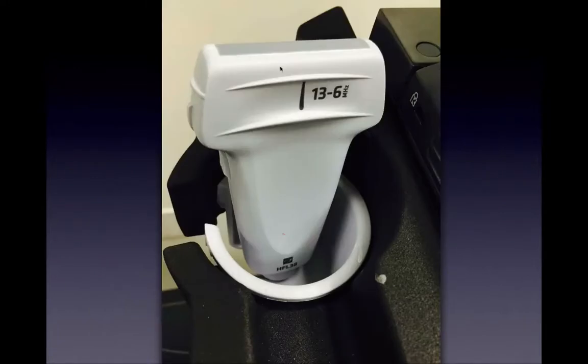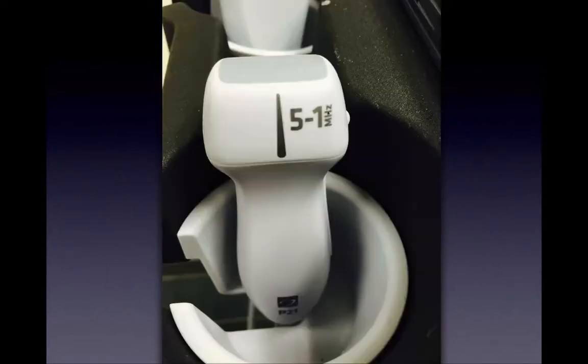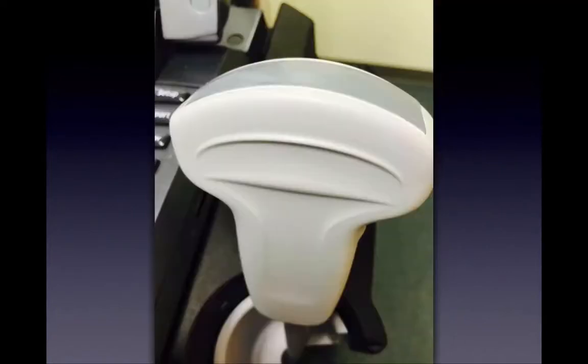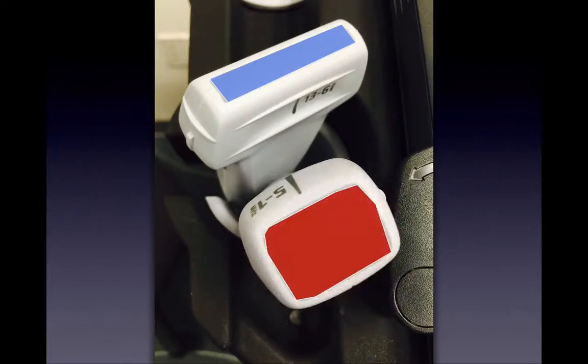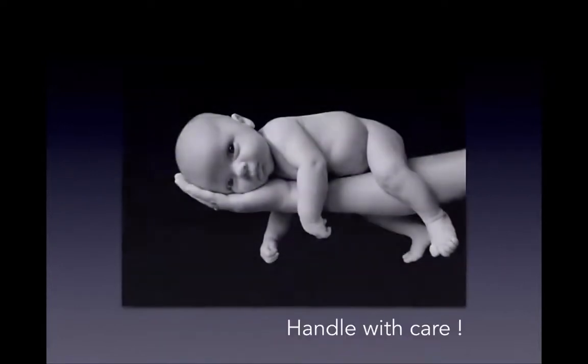This is a high frequency linear, kind of flat looking. You see that it's 6 to 13 megahertz. This is called a phased array, and this is the abdominal probe. And you see that all the probes, regardless of the probes, they all have what we call the footprint, and that's actually where the magic happens, where the ultrasound is actually sending the signal.